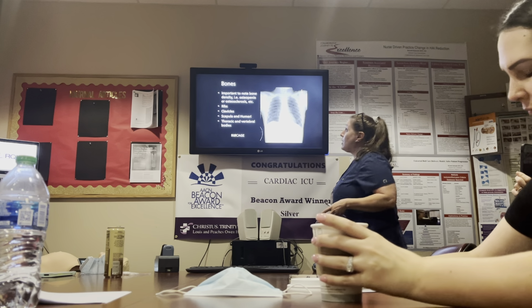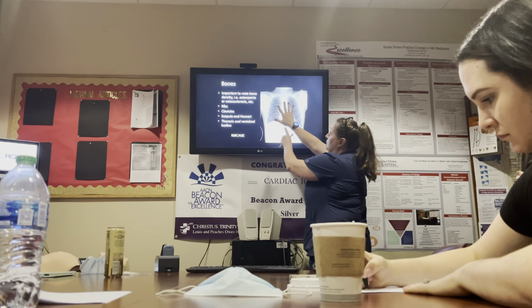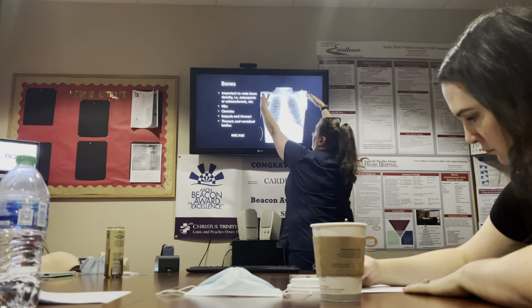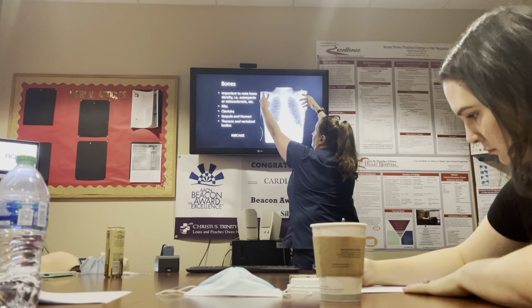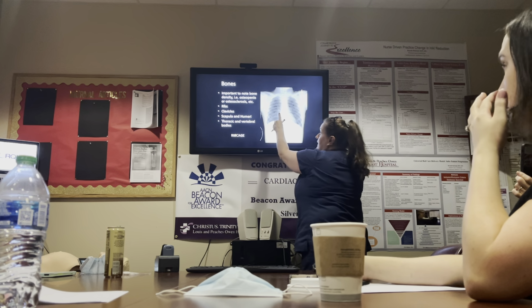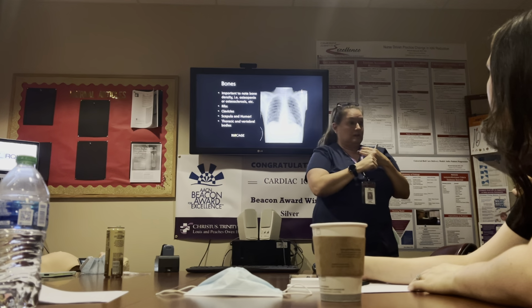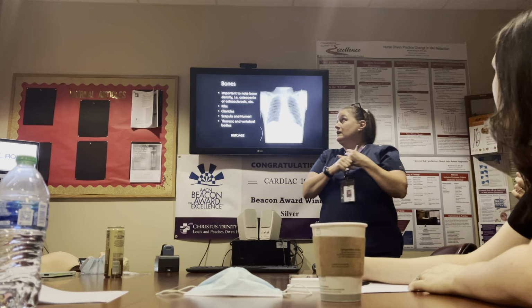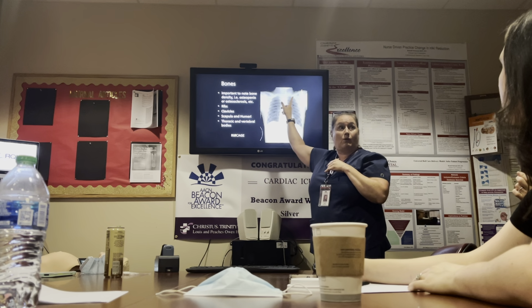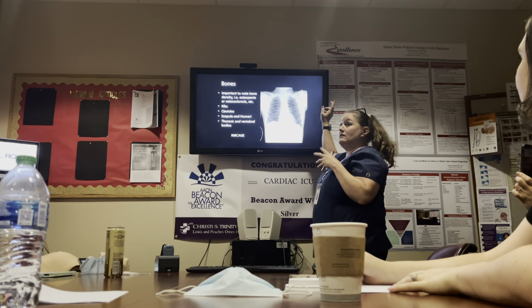All right, so bones. Everybody wants to go to the center of the chest, but when I talk about looking at the bones, you want an x-ray that can actually see maybe some of the arms, the clavicles, the scapula, the vertebrae, and then actually look at the ribs themselves to see, is there any density issues, or are they osteoporotic? Oftentimes if you see that they've had a shoulder replacement or something else, you will figure out that they've probably got osteopenia or osteoporosis that led up to that.